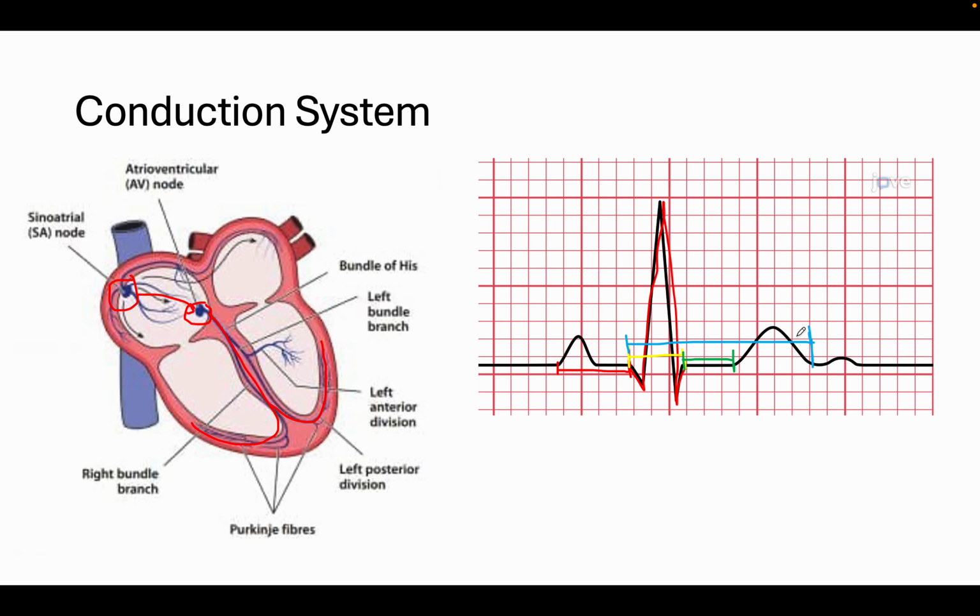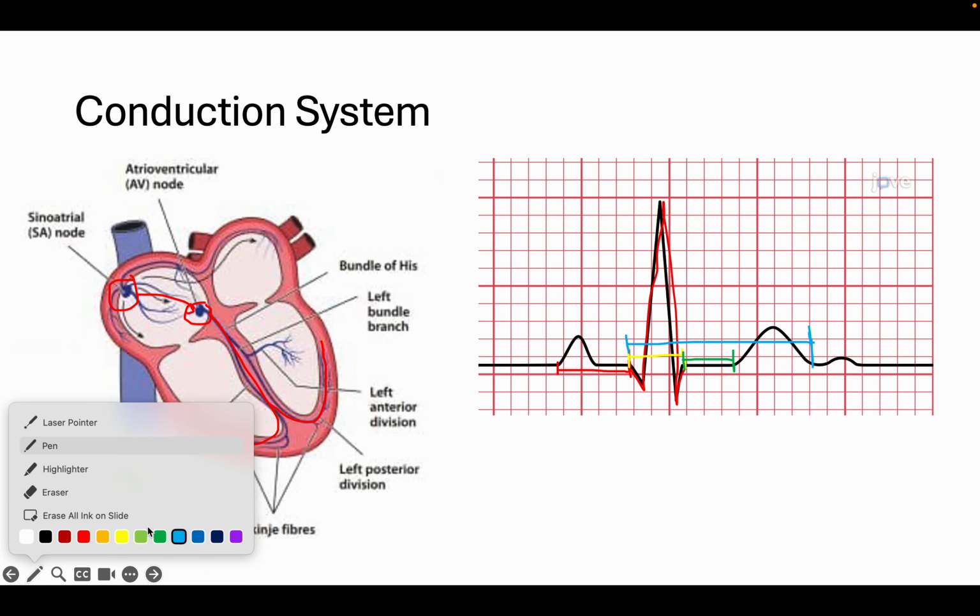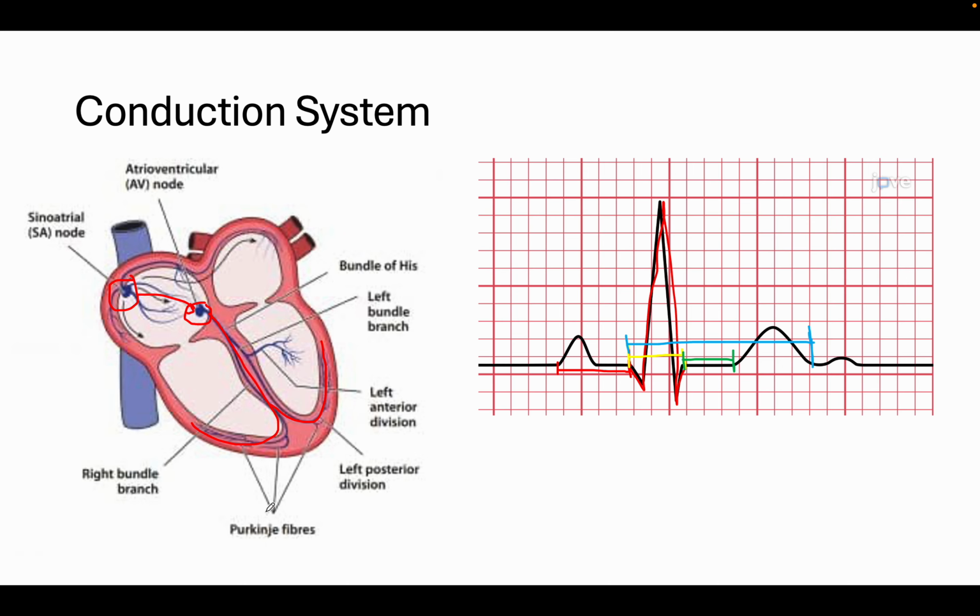And then this last wave that we have here, which we don't typically see in patients, but in this case it's shown in this ECG. This last little bump is called a U wave, and this is associated with a finding in hypokalemia. Again, this will be explored in a separate video. So that's the basic ECG waveforms that you should be aware of.